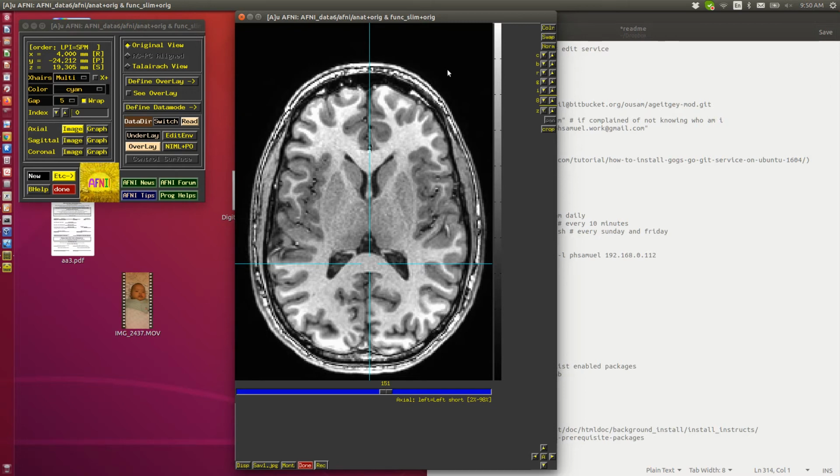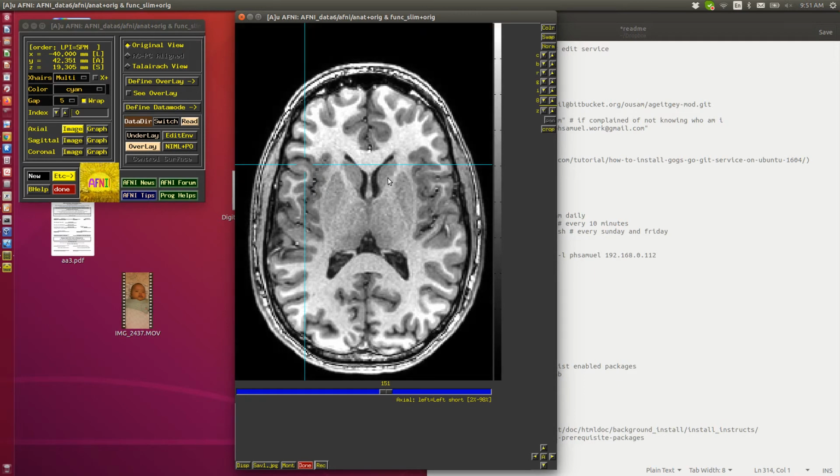What you do, you take a mouse, and you can do this on the trackpad, but it's a little trickier. With a mouse, you click down. If I left click down and release, it jumps the crosshairs like I'm doing right now, right? Click. If I press left click down and hold it down, keep it pressed down, and then drag the cursor location left or right, you can see it's changing brightness and contrast.